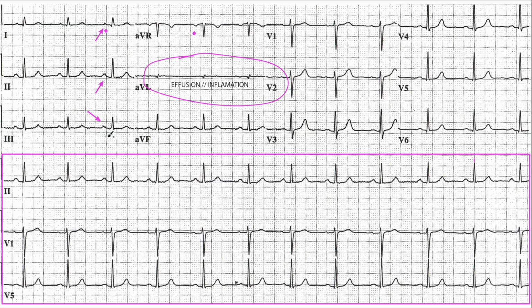This is not just one giant commercial for our lessons, but it is pretty in depth, right? And we're not here to discuss that today. We're here to discuss this ECG. So let's keep doing that. Okay, so again, not an ectopic rhythm here. There's enough information to confirm that this is coming from the sinoatrial node.